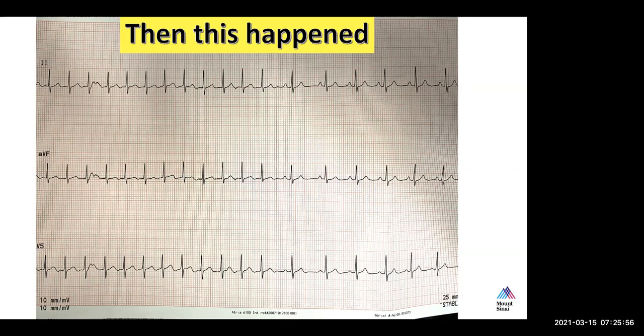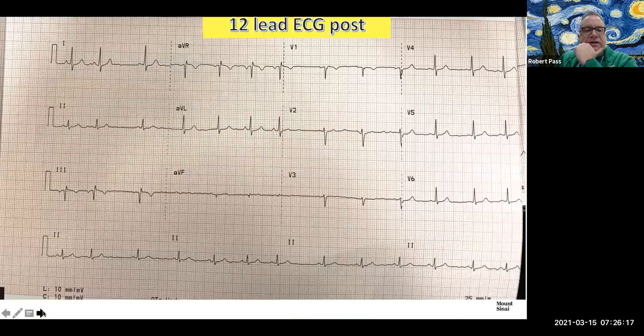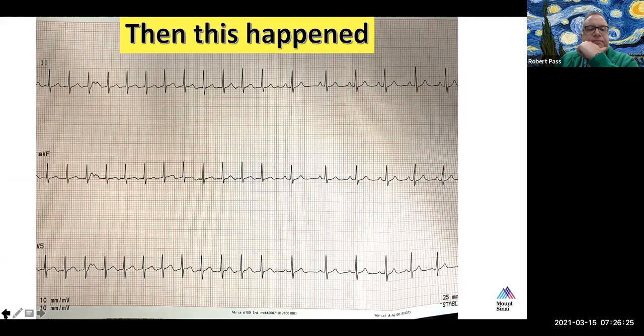He's 16 years. I agree, those are the two most likely diagnoses, ORT or AVNRT. Is there anything about this tachycardia, the tracing, the heart rate, that would make you lean one direction or the other? I believe I have here the 12 lead that was obtained after. I don't know if that matters to you. I'll show you the termination. It's probably more important.